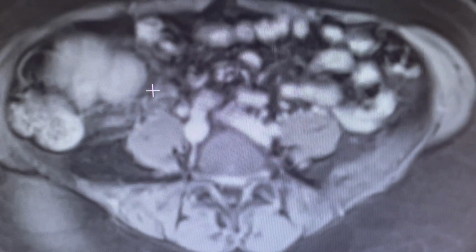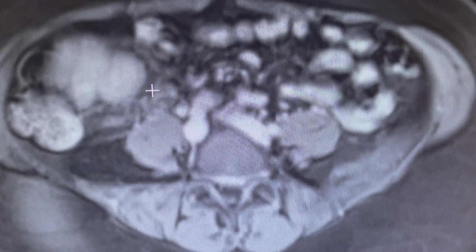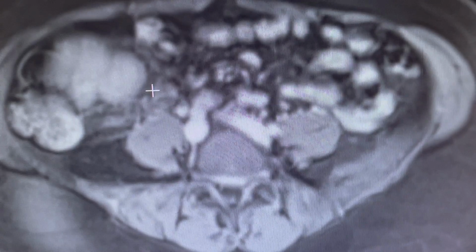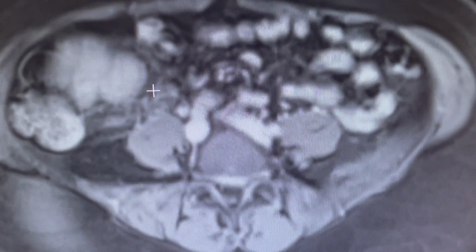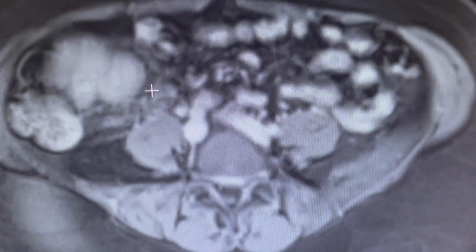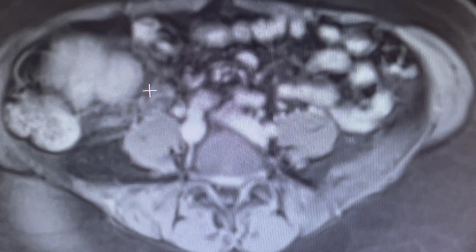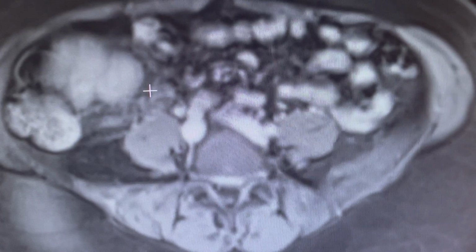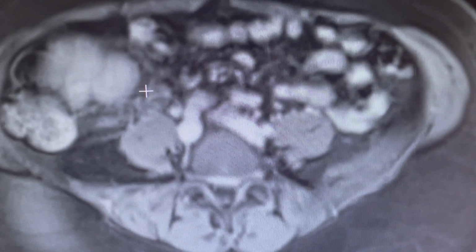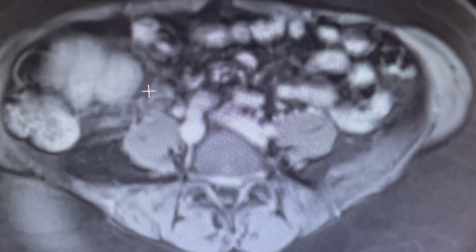And how to explain all of these lesions? We explain it because the individual has the bowel findings of increased enhancement, which is consistent with the splanchnic inflammatory syndrome. What's unusual is she did not show fatty liver, which more or less is a classic combination of fatty liver with bowel enhancement, but she did show the presence of benign liver lesions.